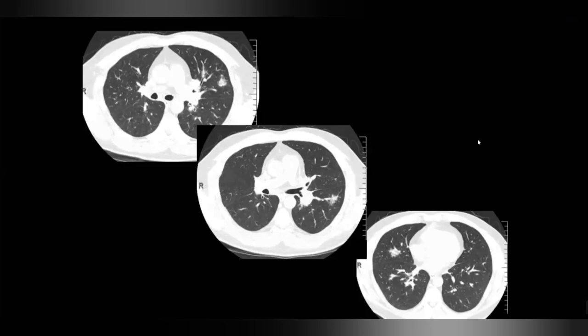So the cumulative findings: there is evidence of left hilar enlargement and a few variable sized nodules in the left and right lung field, some showing irregular and spiculated margins in the peribronchovascular distribution. So I would like to rearrange my differentials, which I told on the plain X-ray. It could be a central obstructing mass with some metastatic deposits. It could be even sarcoidosis. And the third, it could be an infective process like tuberculosis, but it would be the least likely differential here.